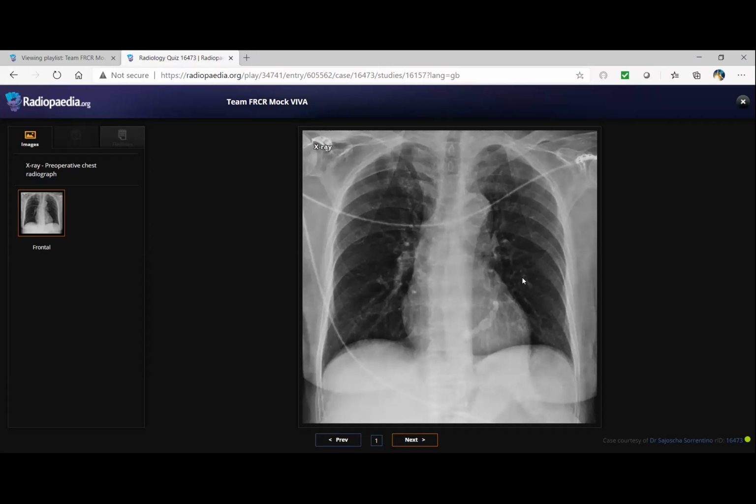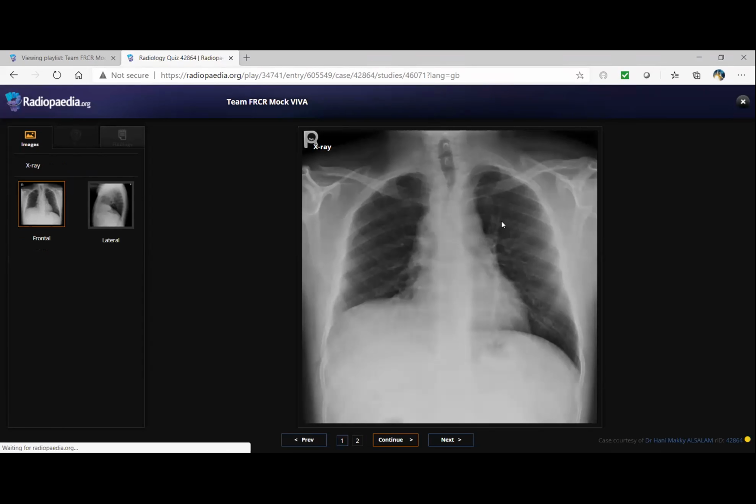So I will refer this patient for an echocardiography and a cardiology review. It can be a calcification of a mitral valve. Yeah, excellent. Okay, so this is probably, as you mentioned, in the region of the mitral valve. Okay, your next case.